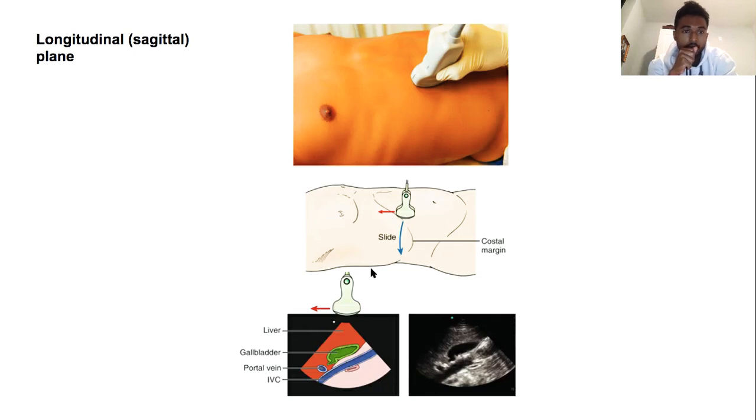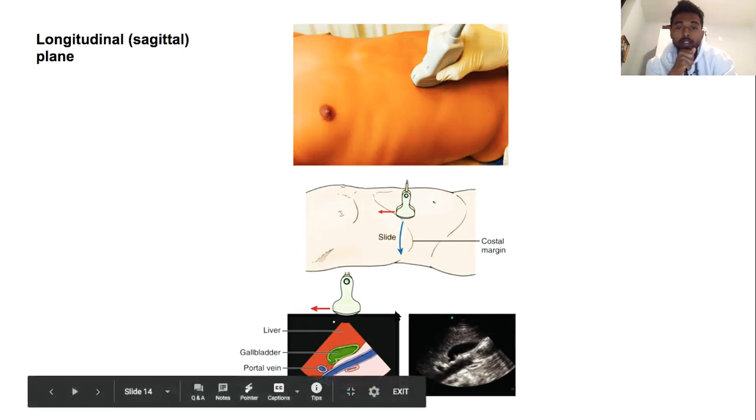Now I'm gonna give you a little trick. It's gonna help you out. As you can see, this is the liver. They give you a little anatomic landmark or reference. So this is the liver, the orange or pink.